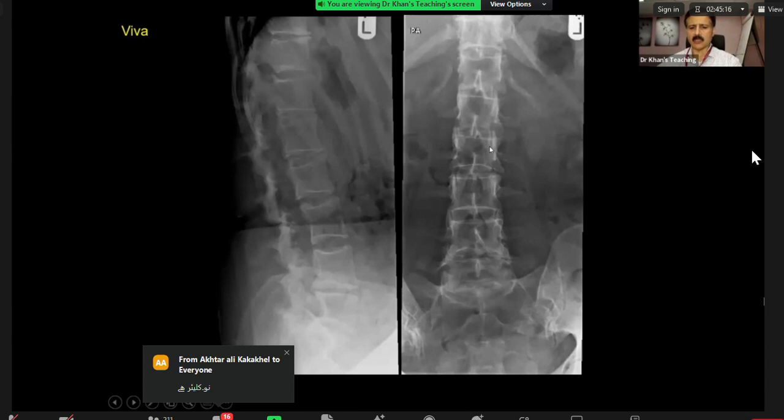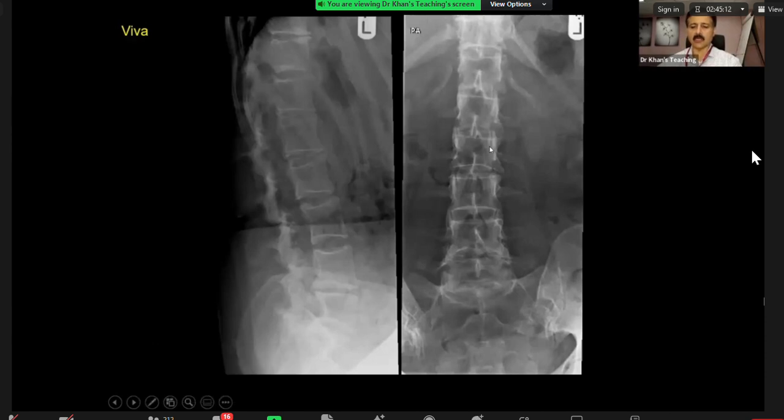And in your Chapman, there is a differential diagnosis in MSK, or in the spine, for increased interpedicular distance. So, classical exam case. Now, if you look at the lateral, the examiner can also just begin with the lateral. Here there is posterior scalloping, and there is a differential diagnosis for posterior scalloping. The beauty of this case is that if you look at the pedicle here, you can see the pedicle well. Here, the pedicles are missing.